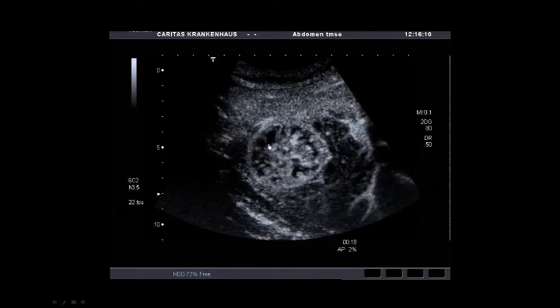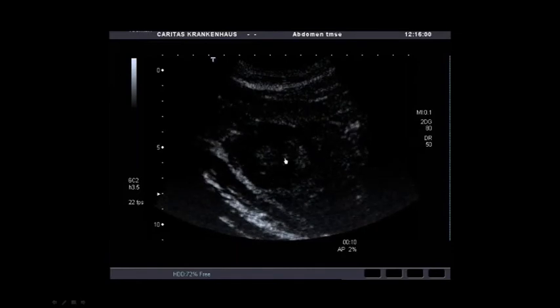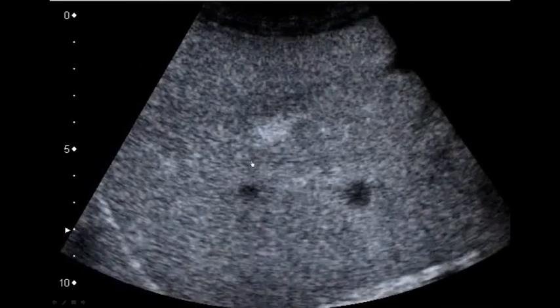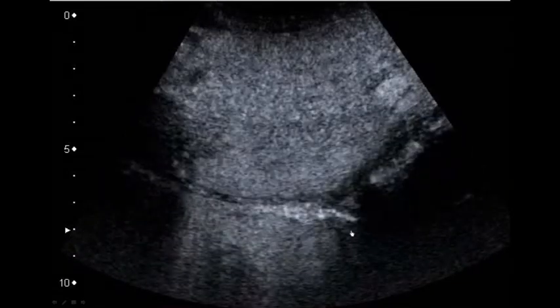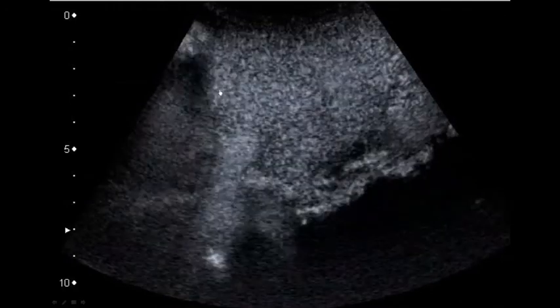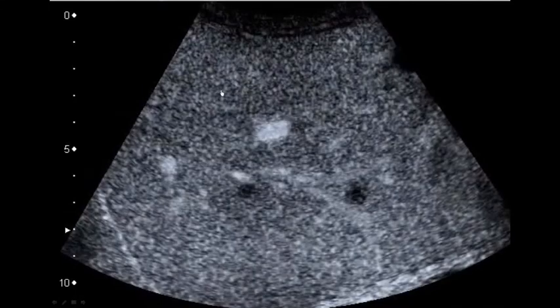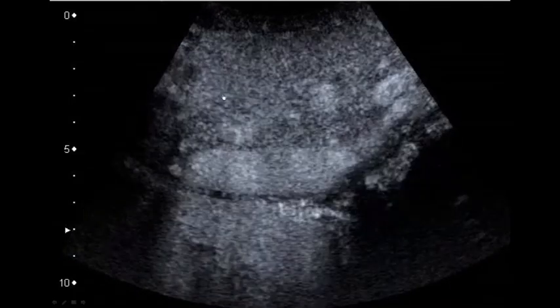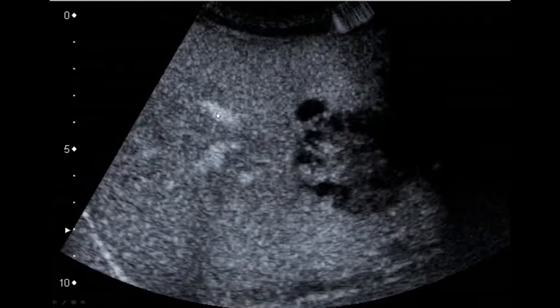And this patient was referred for operation. CT and MRI didn't show any additional lesion. But as you can see here, there have been tiny spots in the surrounding liver parenchyma which showed hypoenhancement in the portal venous and late phase. And that means that such lesions can not only be detected, and I mentioned beforehand, detection of hypoenhancing lesions in the late phase means liver foreign tissue and quite often malignant infiltration.